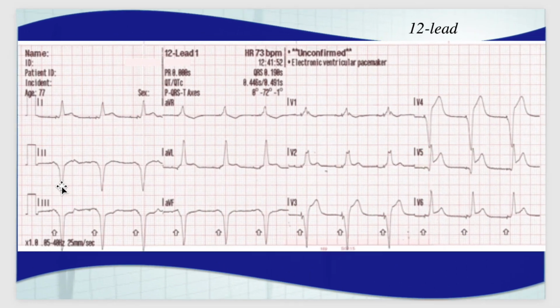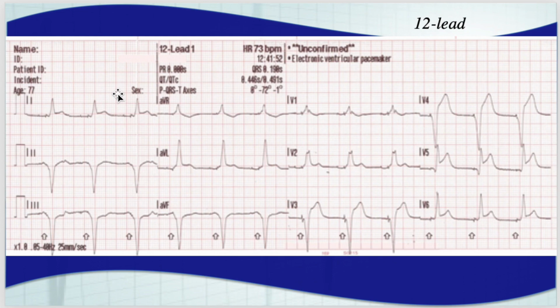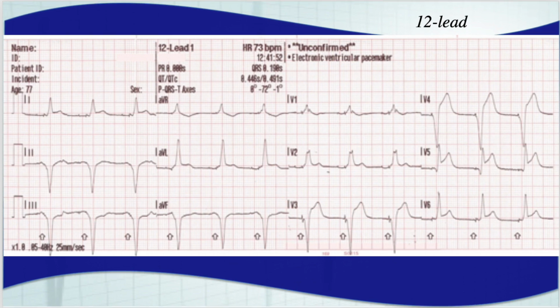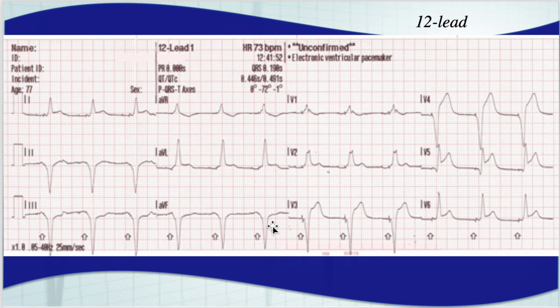Here's another 12 lead. Now this 12 lead is showing you a paced rhythm, all right? And I should state where I get some of these 12 leads from. This first one that I was showing you was one that I've acquired. This one showed up on Dr. Smith's ECG blog. So this is a paced rhythm, and you can use the Sgarbossa criteria to identify the presence of an MI with a ventricular paced rhythm.